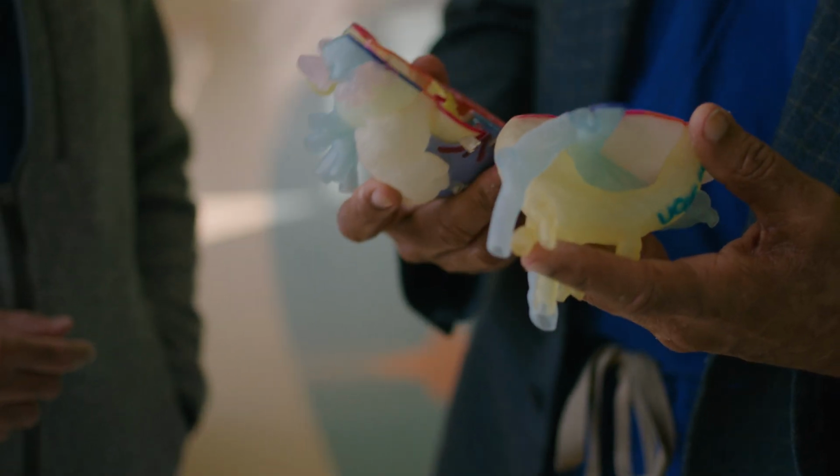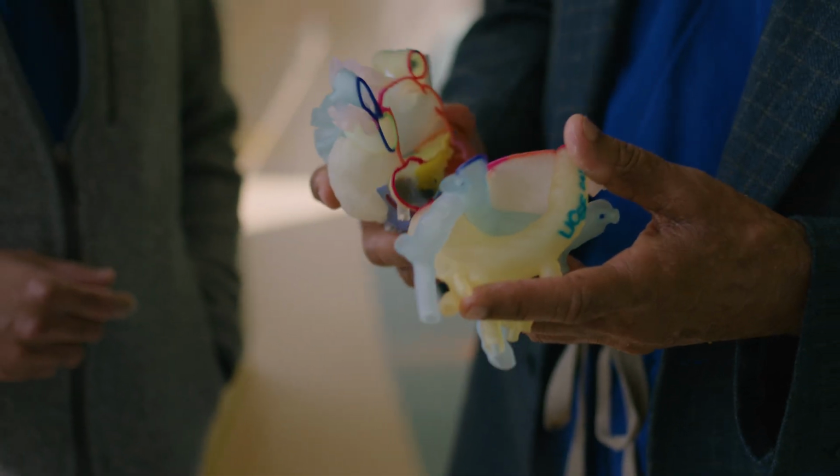So we could see all the chambers, all the outflows, and all the inflows, and this provided the surgeon the information necessary to decide whether this can be a two-ventricle repair or a one-ventricle repair. Using this model, our surgeon, Dr. Mohan Reddy, was able to do a successful two-ventricle repair, and I'm happy to say that the patient is now doing well. She has higher energy levels, her oxygen saturations are very good, and thankfully this was one of those cases where the 3D model helped lead to a better outcome.